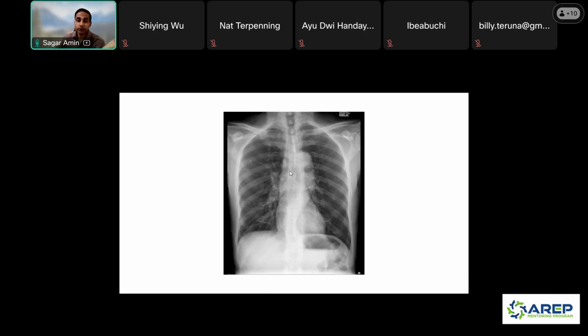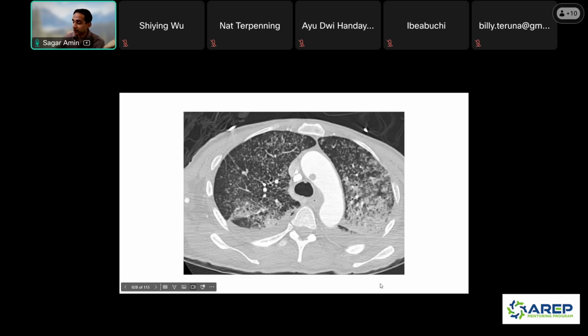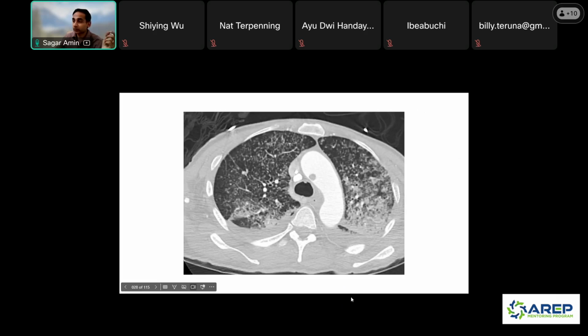So here's an X-ray. It looks pretty clear, right? Not a whole lot happening in the lungs. The main finding we have is this calcification right here, this calcified nodule of granuloma. And then there are ipsilateral, or on that same side, calcifications along the hilum and then the right paratracheal area. So this is an example of prior TB that's healed. We refer to this as the Ranke complex. You can see here, with some arrows, some calcification there and there. So, healed TB.